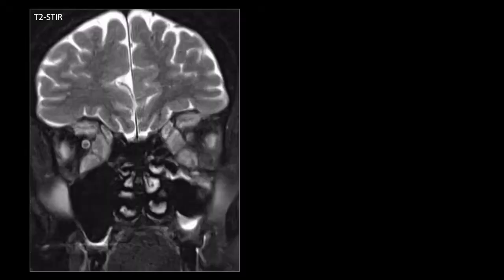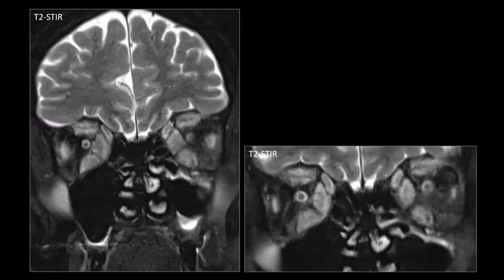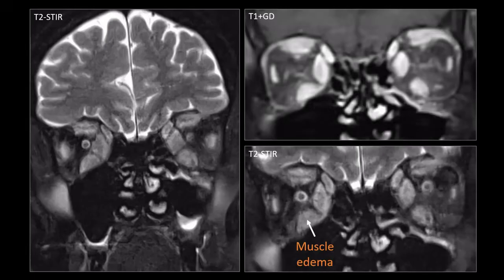This is what acute thyroid eye disease looks like on MRI images. These are fat-suppressed T2-weighted images, and we see, if you enlarge them, that the muscles are bilaterally enlarged. I'm slow. We especially see enlargement of the inferior, medial, and superior rectus muscle, but not so much of the lateral one. And we see muscle edema, hyperintense signal.